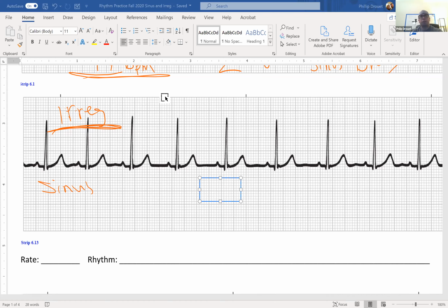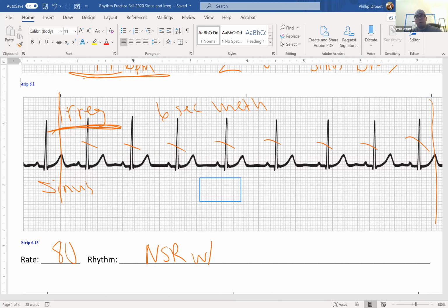So what you're going to use is the 6-second method. We're going to use your 6-second markers from there down. There down, we got 1, 2, 3, 4, 5, 6, 7, 8. I have a rate of 80 beats per minute. And if I have 80 beats per minute, that tells me I have normal sinus rhythm with what we call sinus arrhythmia.